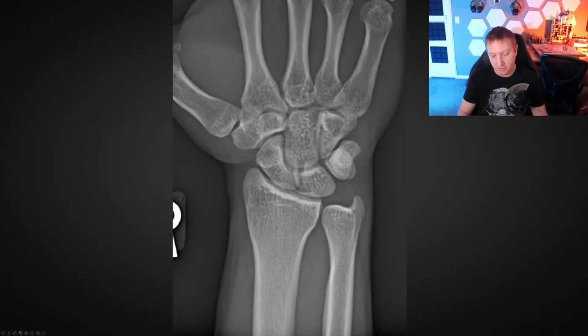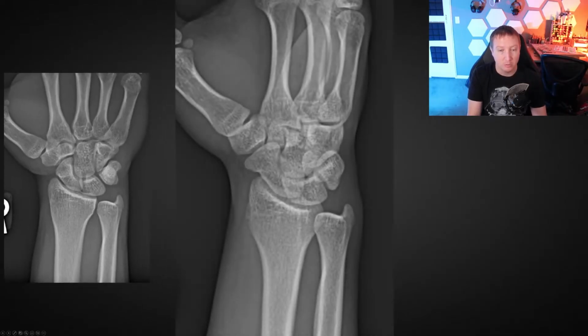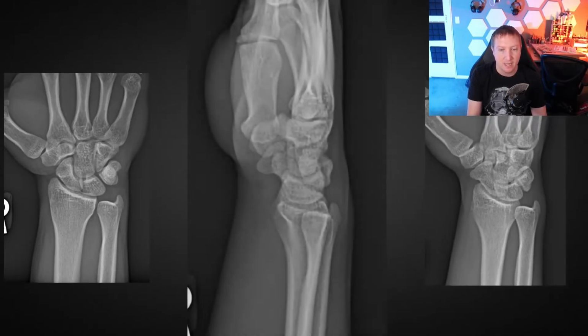Hi, I'm Dr. Matt Skalski, and in this video I want to cover the normal radiographic anatomy of the wrist with you. So let's just dive right in here and cover the standard views which we see in a minimum wrist series, which would be this view, the P to A view, the medial oblique view, and the lateral view.